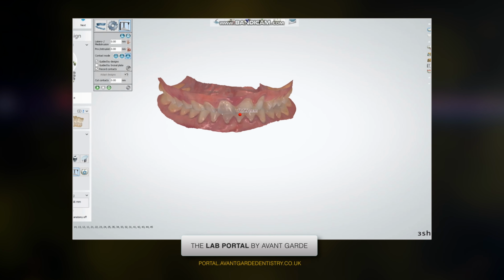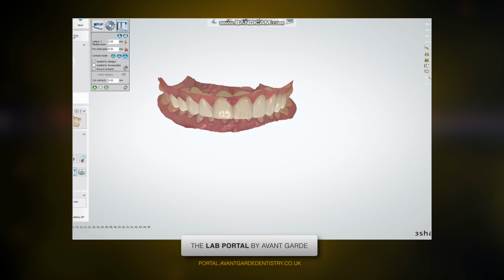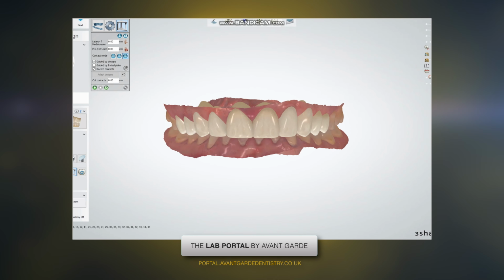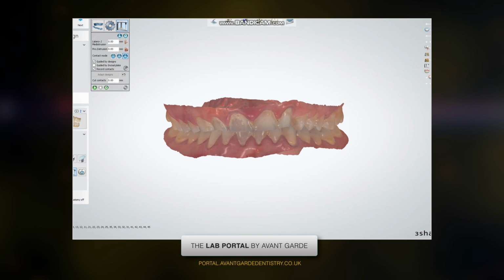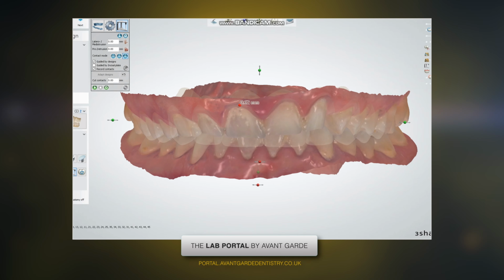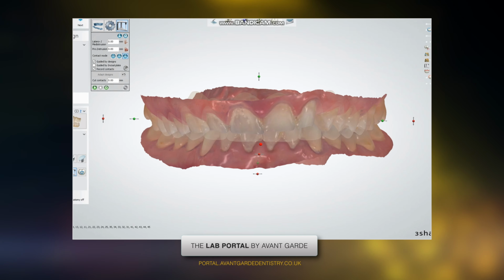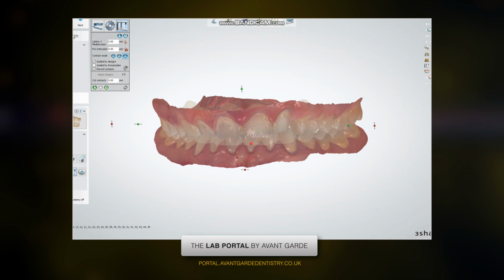So this is the design. So this is the upper. We have managed to get even proportions. So Yaz is just currently designing the upper arch, determining the proportions and the balance, determining how much crown lengthening or gum recontouring is going to be required, how much additional length at the incisal edge is going to be required, and how that looks from an additive perspective from the pre-op.